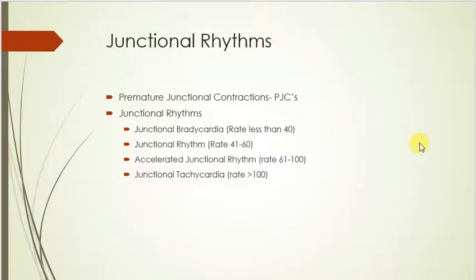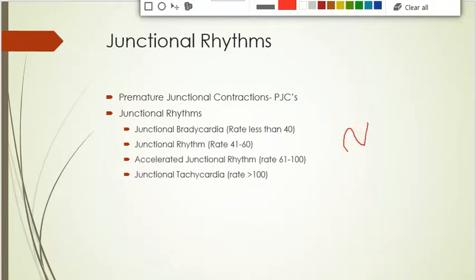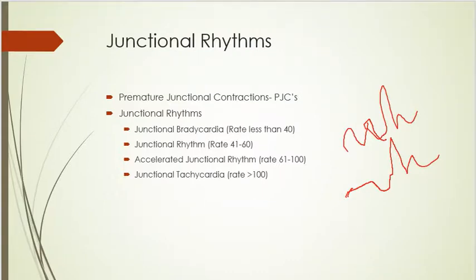It should be giving us a positive deflection. And when it's biphasic, let me maybe draw. It'll look like this, inverted, and then you'll have your QRS here, or you may be just looking at something like that with your QRS and your T here. So typically we say that's really not a P wave in reality, so we don't consider it to be a P wave.